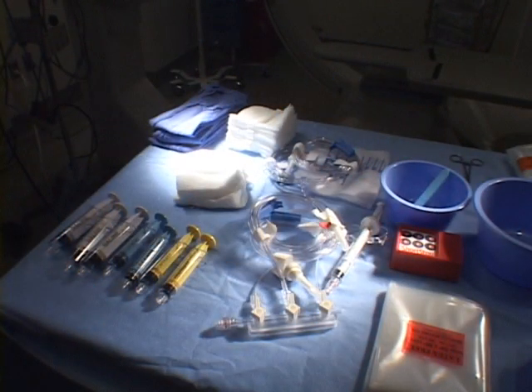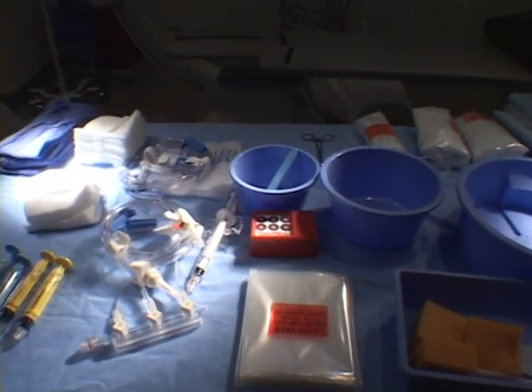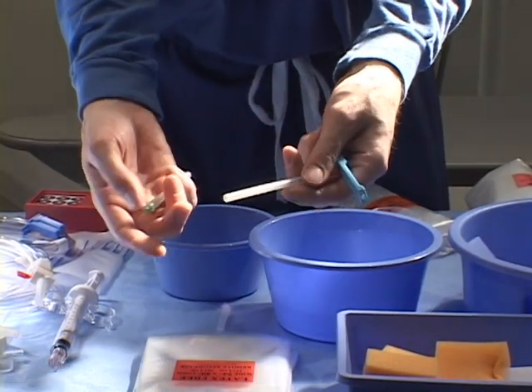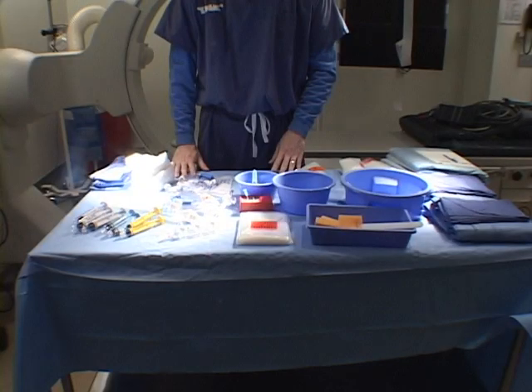Preparation of the cath lab requires many supplies and disposable equipment. In the cath pack, you will find the sterile package opened and syringes shown in color coding on the lower left, gauze, tubing, manifold, flush containers, sterile drapes, safety needle holder, and a variety of other needles, equipment, and wires. This cath pack is designed specifically for use in a particular laboratory and may vary from laboratory to laboratory.